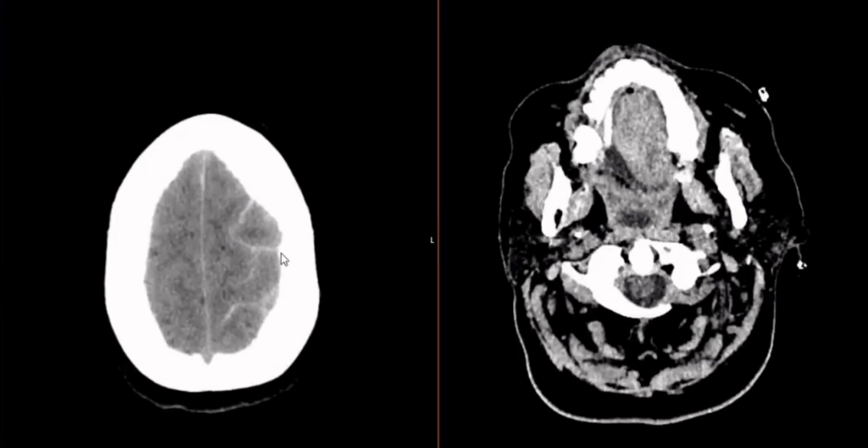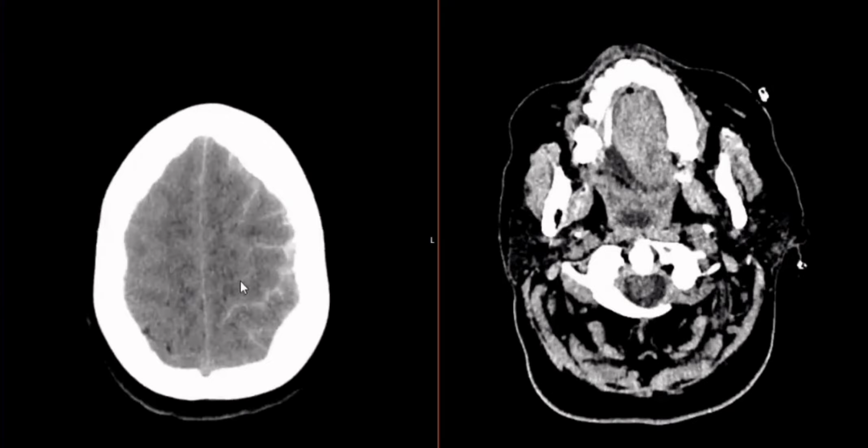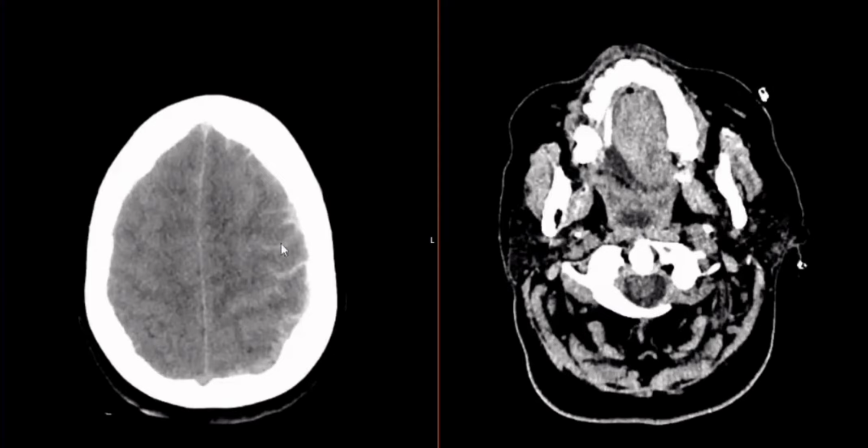What is in that CSF space that should be black? Blood, because it's white. And then more blood, so following the sulci, the blood goes into the sulci, which makes it what kind of hemorrhage? Intra. So you've got extradural, subdural, or subarachnoid? Subarachnoid. Subarachnoid goes down into the folds, yeah.